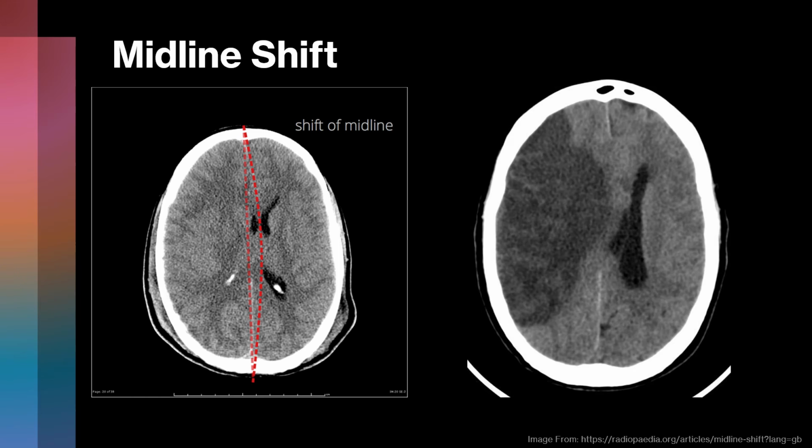So now we're just briefly going to discuss midline shift, as I mentioned earlier. This can be due to a space occupying lesion or tumour, or any of the haemorrhages we have discussed previously. And this is most commonly due to raised intracranial pressure. You measure the shift in millimetres, and the midline is assumed to be in the same position as the falx cerebri, although some care has to be taken as some patients may have a midline that differs to this. And this can potentially be viewed and measured on previous images, if any exist.